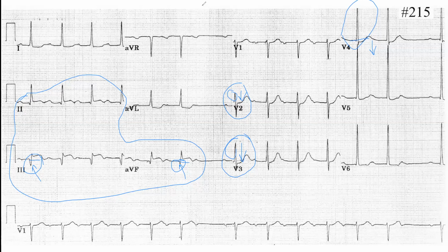Okay, now the next one. Do we see any sign of hypertrophy?